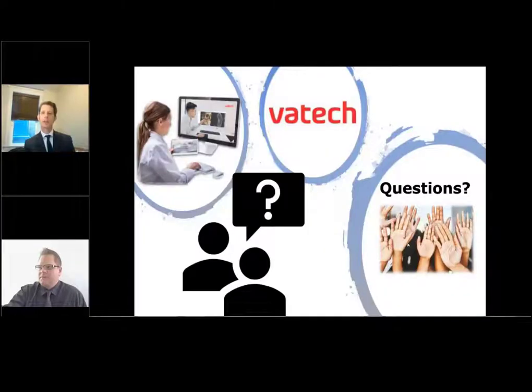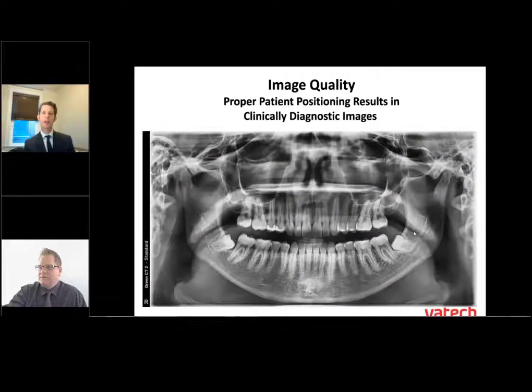So next, Paul, we've got a series of images that we want to look at. I would say the image on the screen here is the desired image we're getting, or pretty close to that. You can see we have a very clear anterior. My condyles are straight up and down. I can see the nice sinus floor right through here. I can actually see my anterior root tips.